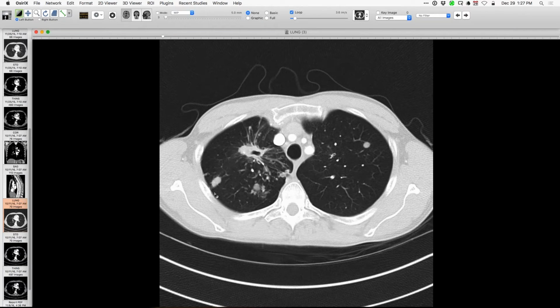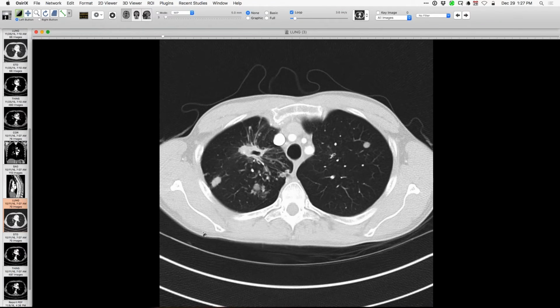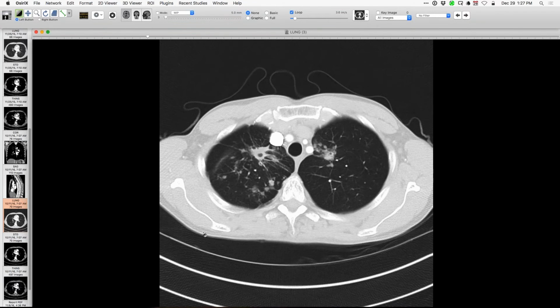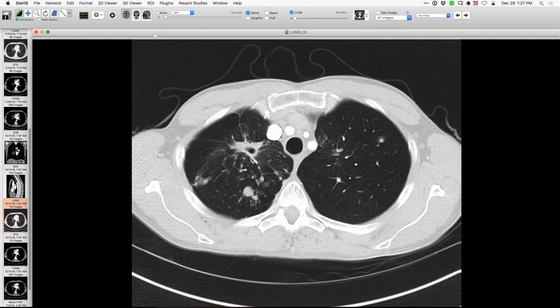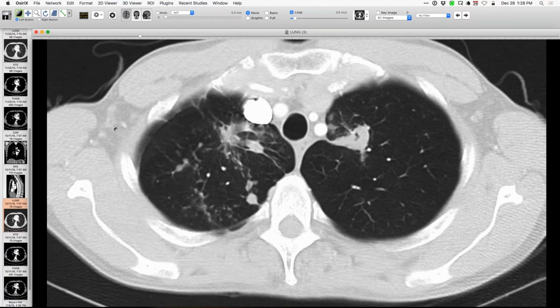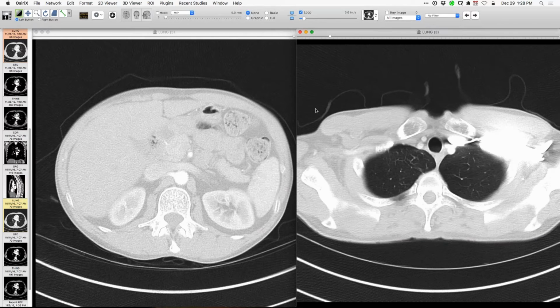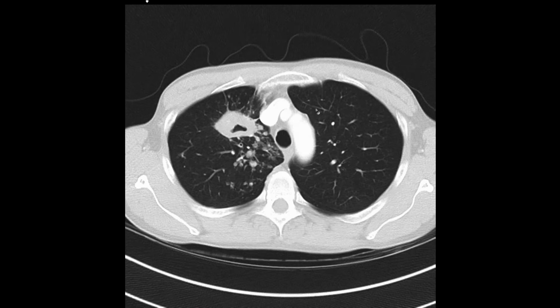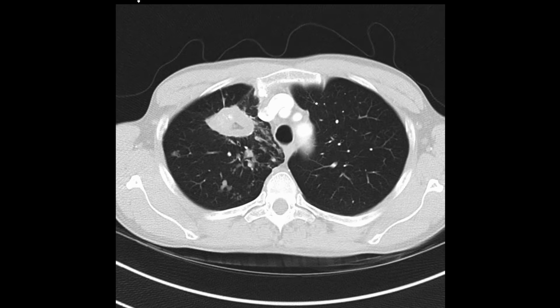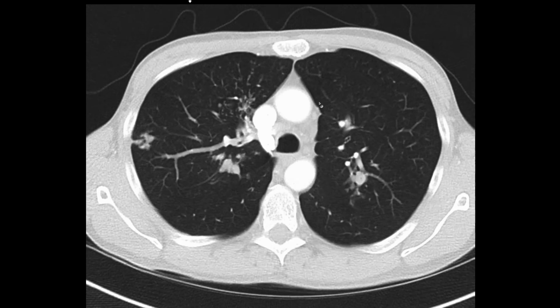So this should worry you. This cavitary lesion I don't usually associate with sarcoidosis. I think this makes a good point that you're pointing that cavity out, because you can get cavities with sarcoid, but they're associated with scar, volume loss, the ones we see aspergillomas in. And if you look at your initial CT, it's more of a mass that's cavitated. There's not a lot of distortion around it. You can get big masses in sarcoid, but that should raise some red flags. Plus, it's strikingly asymmetric. Yeah, it is. It can happen, but not typical.